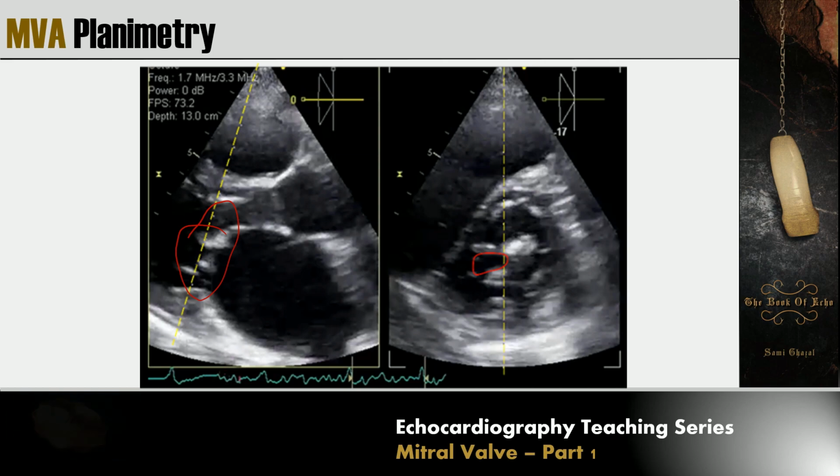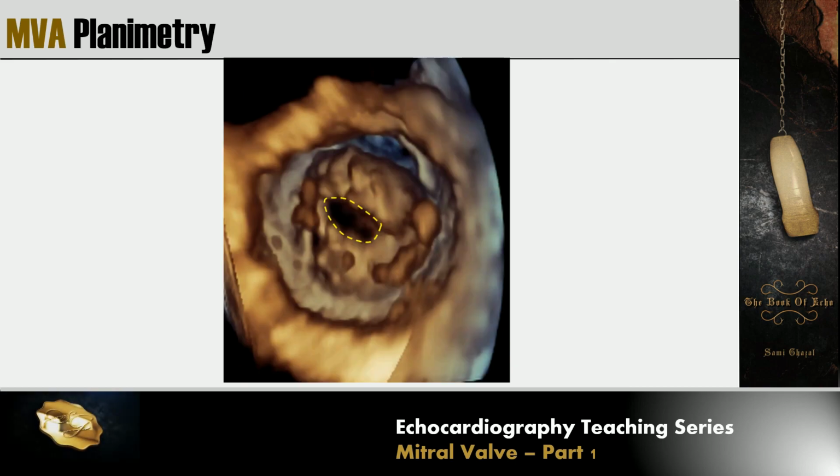And then when we do that, we will make sure that we are really aligned at the mitral leaflet tip, and then we can do the planimetry with high accuracy. And when 2D image quality is good, 3D imaging is available. The 3D planimetry is the most accurate and superior method, particularly when viewing the mitral valve from the LV perspective.